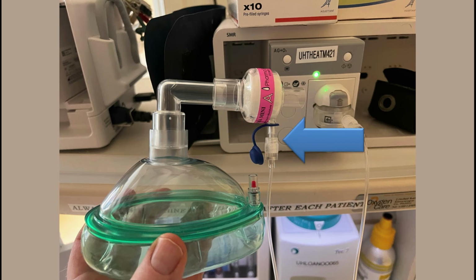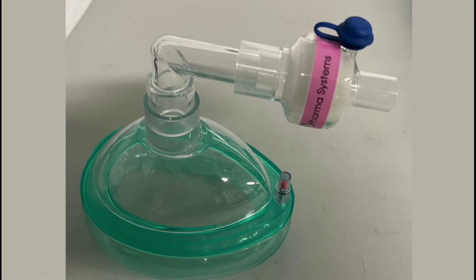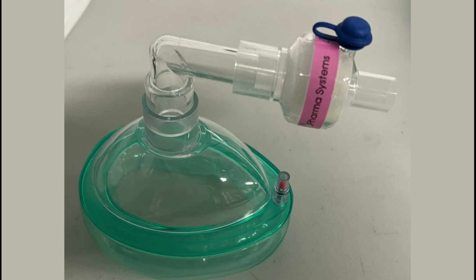Somebody forgot to attach the sample tube to the heat and moisture exchanger, so the analyzer is sampling room air. That is something that should always be considered if the end tidal is 0. There is perhaps nothing more embarrassing during the inevitable panic of a no CO2 trace than to peer at the heat and moisture exchanger and see this blue cap connected, meaning that the side stream analyzer tubing is not attached. Please don't humiliate your assistant. It is your responsibility to make sure that the equipment is working.